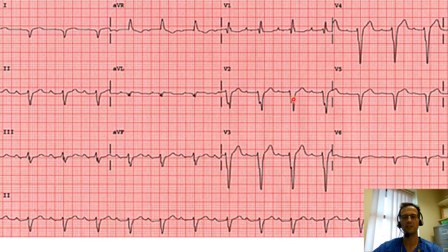This is a very early transition from positive to negative. And this is obviously a typical appearance of left bundle branch block, which is where the confusion comes in. And it looks like left bundle branch block really from there on, although here we've got an S wave rather than an R wave. So not really making sense at all. And look over here. Can you see that this is right axis deviation?